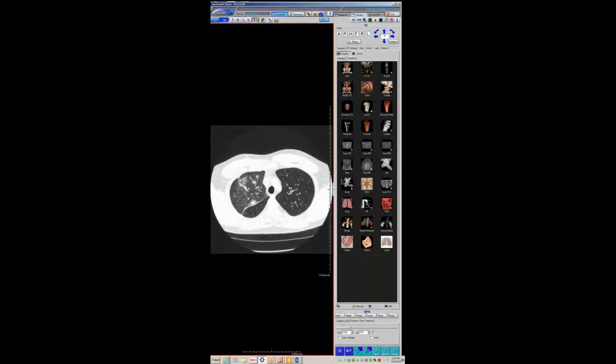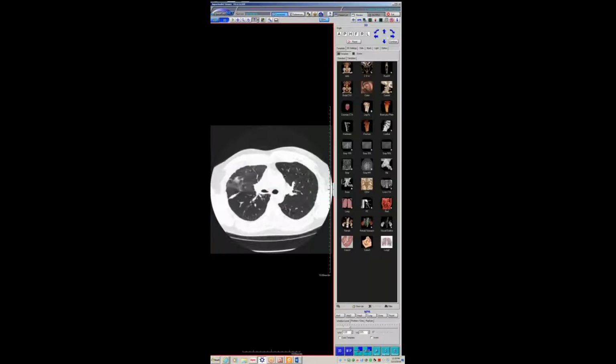And we did a RadPath conference, and they did a bronch washing, and the washing was read as no malignancy or pneumocystis, which was fine. But then they showed in RadPath conference, and this kind of popped up from the bronch. There's a lot going on here besides no pneumocystis or malignancy. We can see all of these hemosiderin-laden macrophages all over the place. The new red blood cells, who knows, that could be from injury, but this patient has clearly been hemorrhaging for a fair amount of time, to see all these hemosiderin-laden macrophages. So this is chronic recurrent hemorrhage.